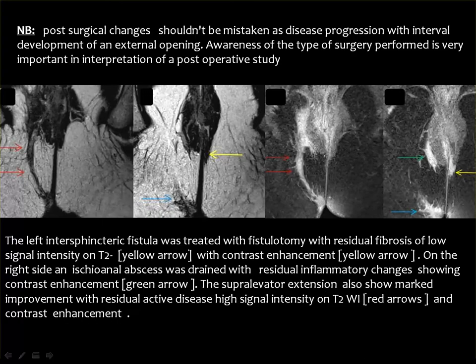One of the important issues is, after treatment of the anal fistula, you get some granulation tissue and fibrosis at the site of the healed fistula. If you inject this granulation tissue with contrast, it will enhance. Then you should discriminate whether there is residual activity in the fistula, or there is an abscess, for example, or this is just healing granulation tissue at the site of the fistula tract.